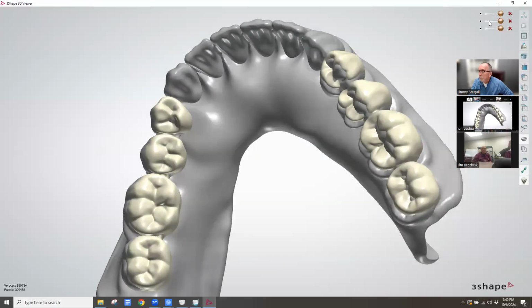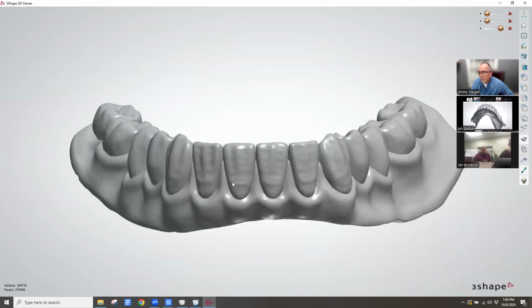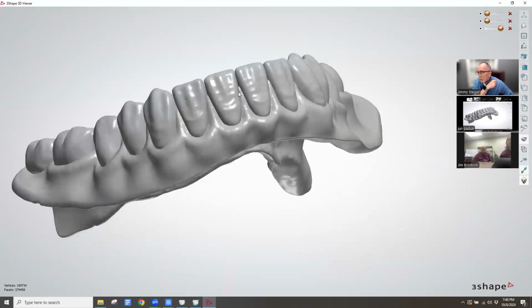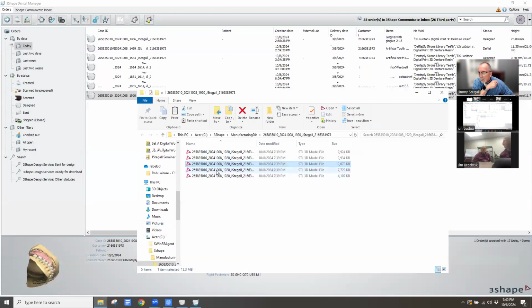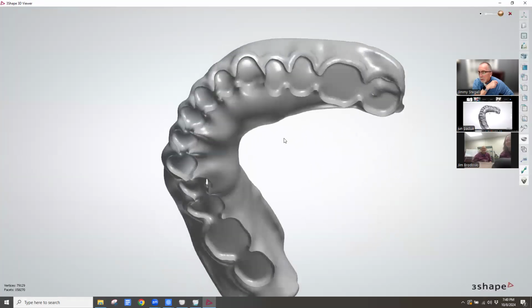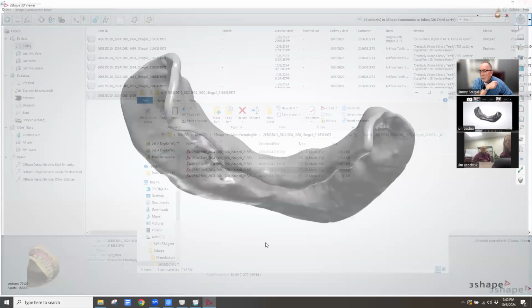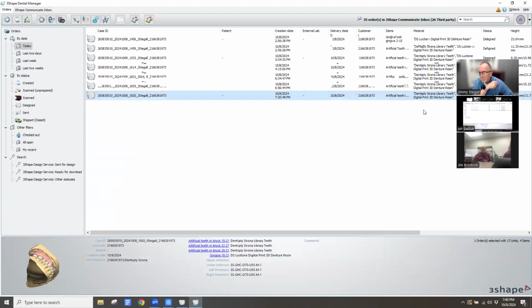So I wanted to do that in a prototyping method. And typically, if we're doing an all-on-X on the upper and a locator on the lower, I'll print this monolithic one out just for bite adjustment, tooth position analysis, all that. And there's the pocket denture. And yeah, maybe a little thin back here. Not bad. All right, locator. Pretty simple, right? Just modify the model in the beginning.